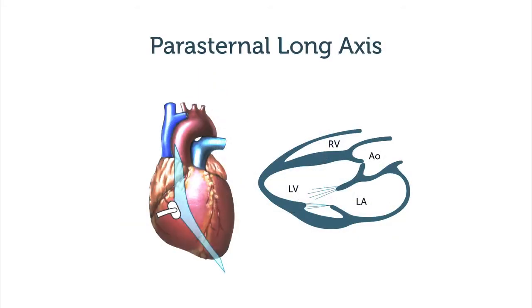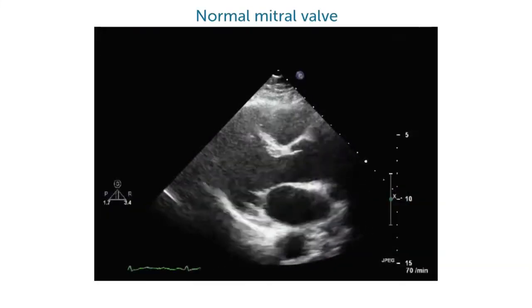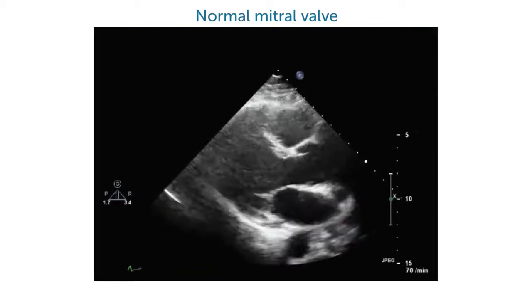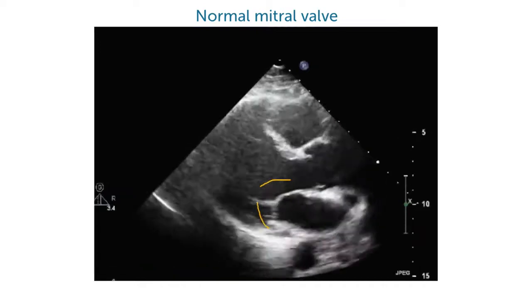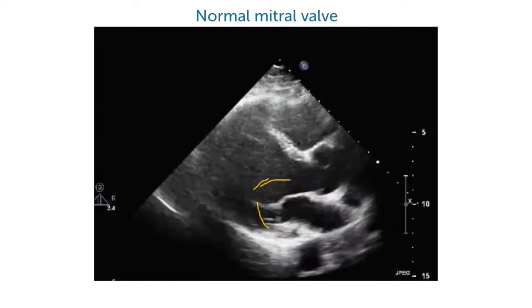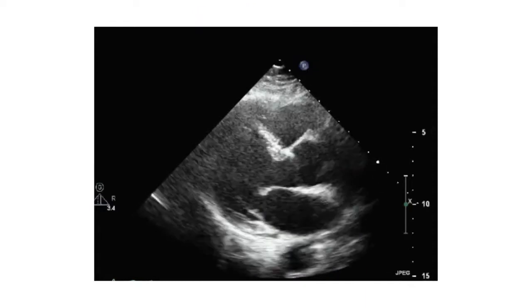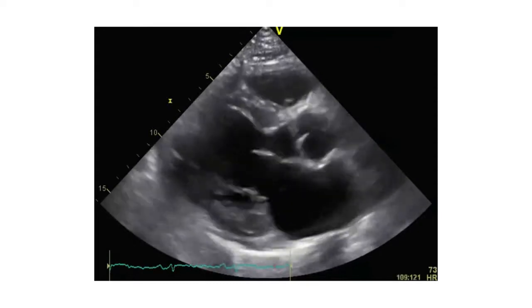So we were cutting the heart in a parasternal long axis view, so right following this line, and the mitral valve would be actually this level. So you were looking at a normal mitral valve. Here's again another example. You can see really nicely the anterior leaflet next to the aorta, the posterior leaflet on the other side, and compare the length. The anterior leaflet is longer than the posterior leaflet. So this is a completely normal valve, opens really good. The leaflets are not thickened, but here I think we are ready for some pathologies.